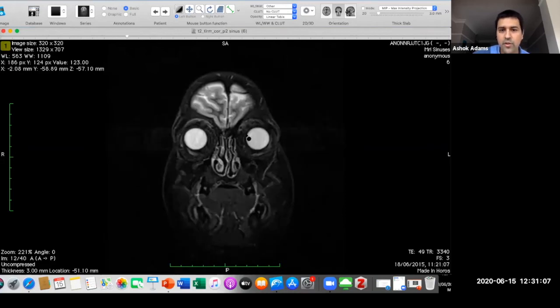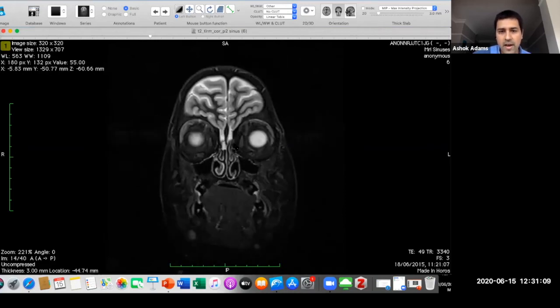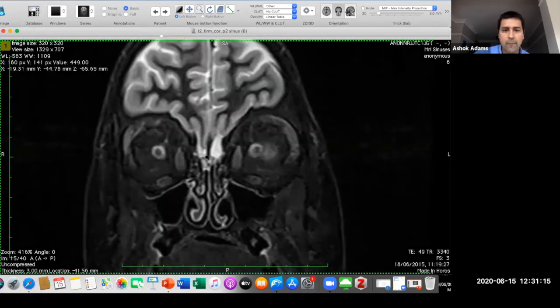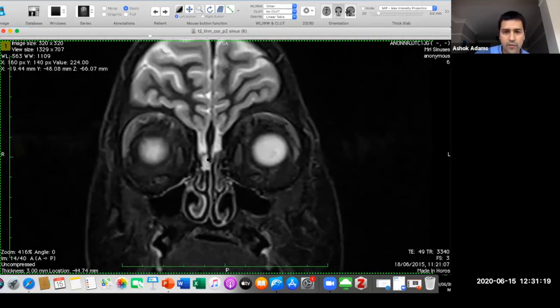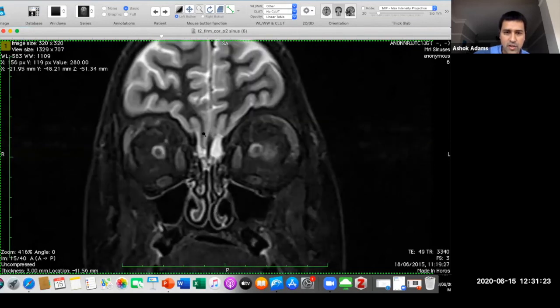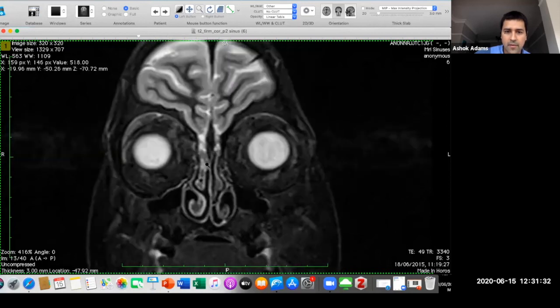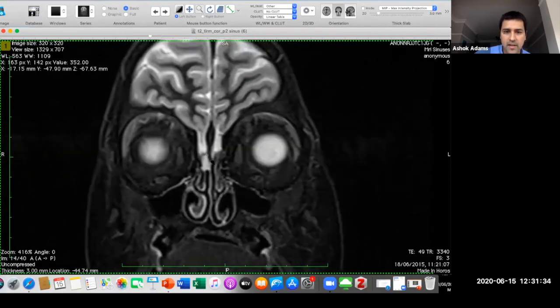So this is a coronal T2 weighted MRI, and why it's useful is because it allows you to work out what's mucosal thickening, what could be soft tissue mass, and in this patient here with that olfactory niche opacification, if we look at the brain tissue, that's the gyrus rectus, that's orbitofrontal brain parenchyma, and you can see how this is almost sucked down or hoovered down further south, and this was a meningocele, and that was the cause of the intermittent nasal discharge.